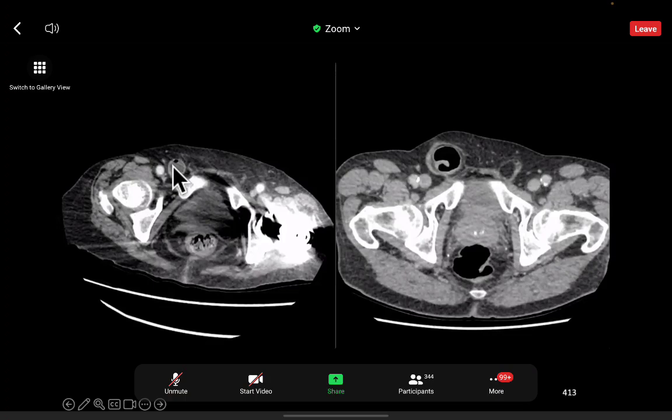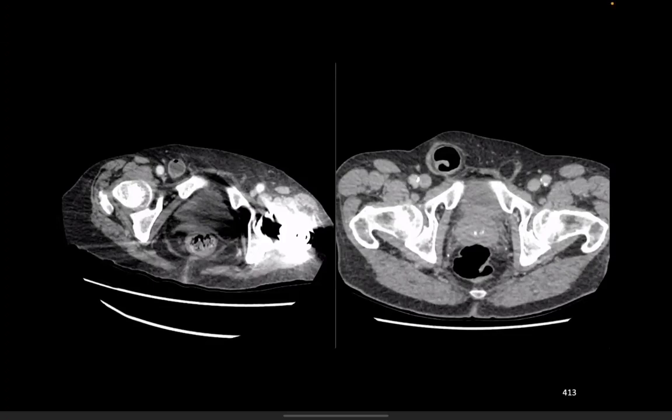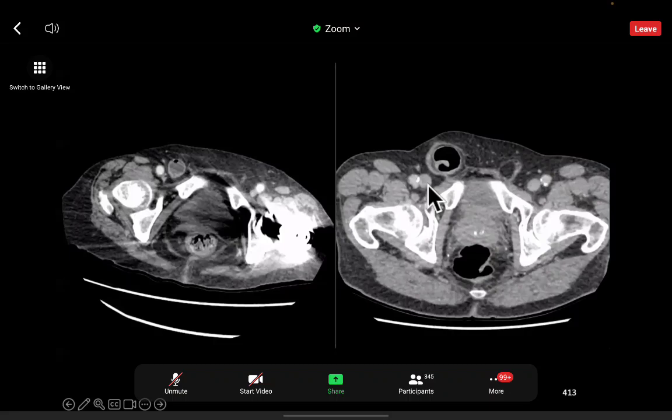And that's a femoral hernia. And that really needs flagging to the surgeon to try and get a prompt elective treatment for that. Whereas this is the inguinal hernia, which has no effect whatsoever on the femoral vein.